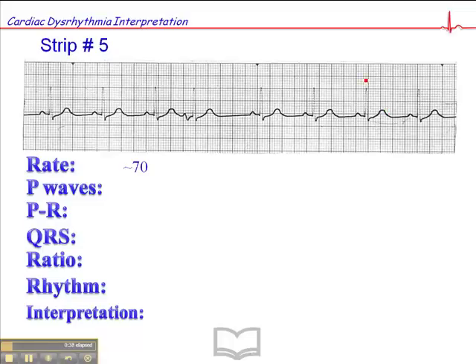area of regular heartbeat. So if I take this QRS complex, the heart rate here is 300, 150, 100, 75, 60. So between 75 and 60 is 15, divided by 5 is 3, so 60, 63, 66, 69. And keep in mind that this one is just off the baseline, so around 70.